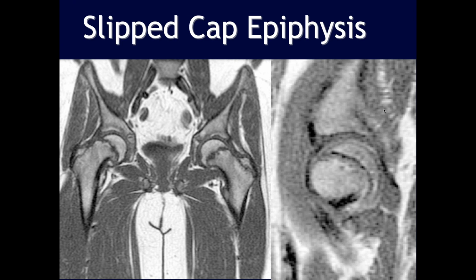Okay. Yeah. So we never measured. The normal epiphysis should extend above on the superior side and below on the inferior side of the metaphysis. The epiphysis should really cover it. If it slips to one side like this, that's abnormal.